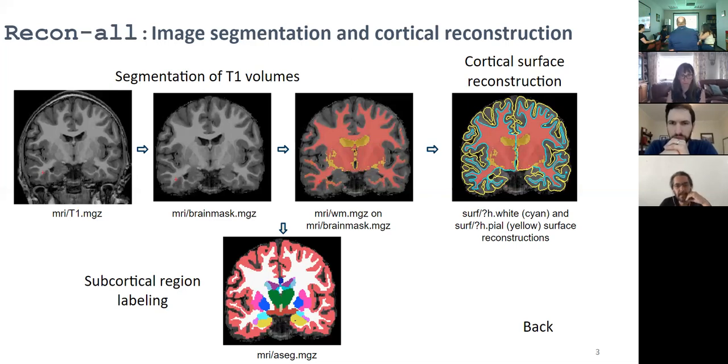And we want to apply that. So wait, is that parcellation or segmentation? That's parcellation. So we parcellate the cortex. We subdivide the cortex, which is of a relatively uniform intensity.